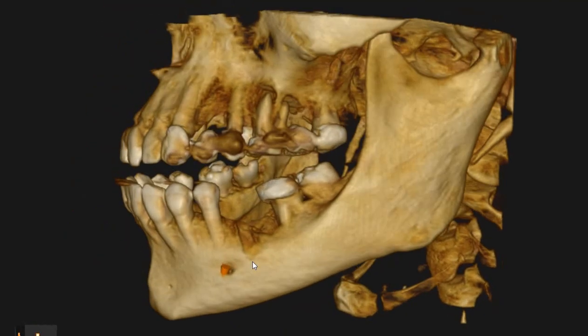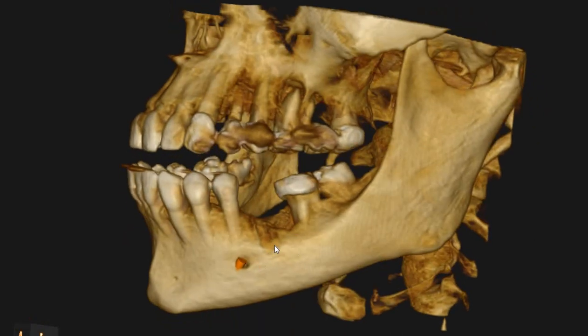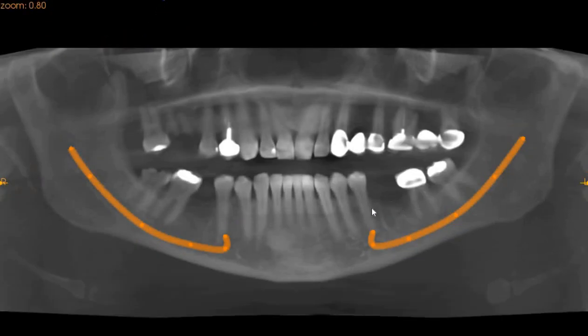Whereas the lower left is edentulous, we can see that there is an extraction socket and we don't see any visible bone grafting material here. Now moving to the panoramic view, we can see we've got adequate space here, but bone quality and bone dimensions we will show you very soon. On the upper right segment, we do have a little bit of a periapical sinusitis present as well.